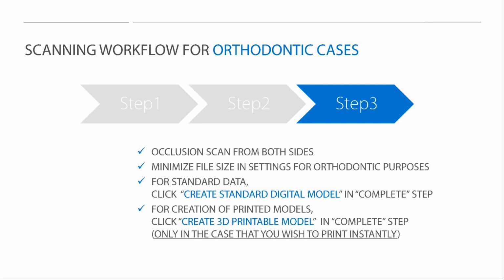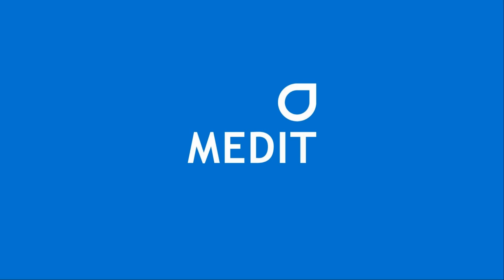So there's no need to do that, unless for some reason you would like to print instantly in your clinic, for diagnostic reasons, for a demo, or for marketing purposes, the model in order to show it to the patient. But apart from that, whenever you need to design a digital restoration for orthodontics, you will just create a standard digital model. Okay. So now let's proceed to see the workflow that we will use for performing the scanning and everything we need.